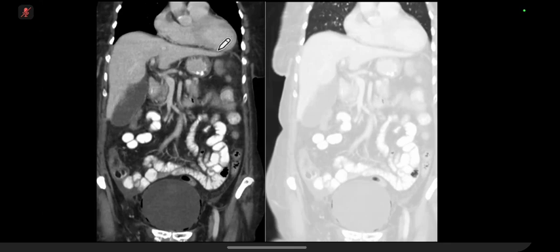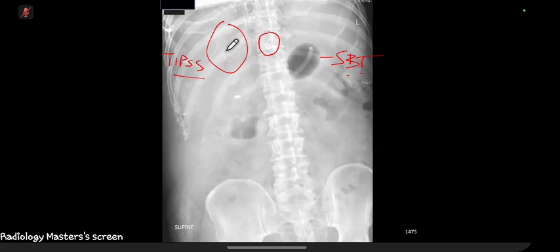Okay, and it's all told by these surgically or in the case of radiology, interventionally radiologically inserted objects, TIPS, clips in the varices, and then the Sengstaken-Blakemore tube.